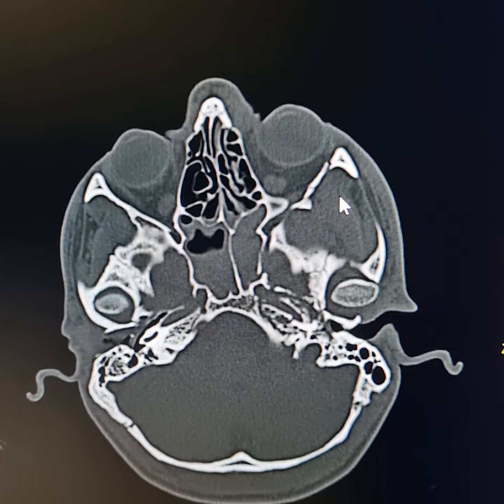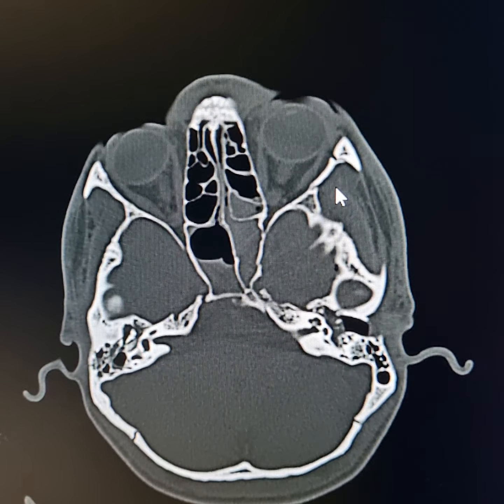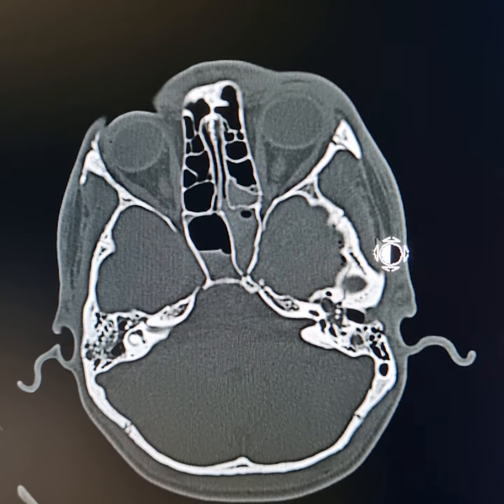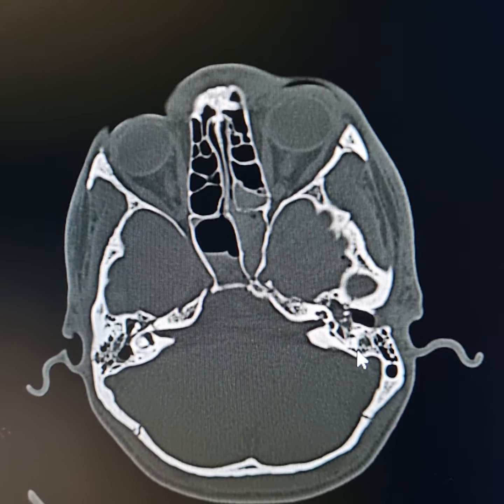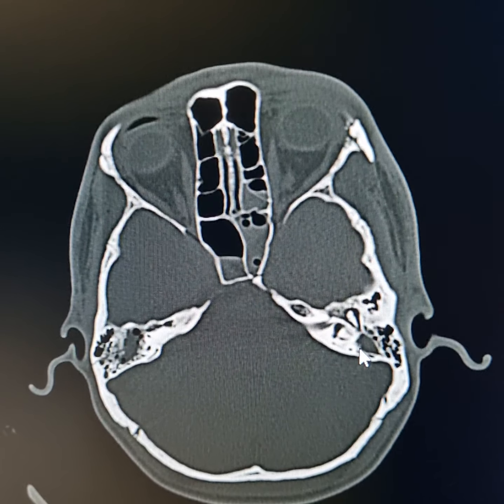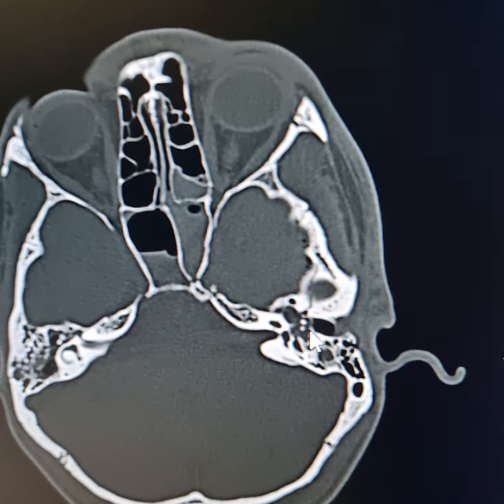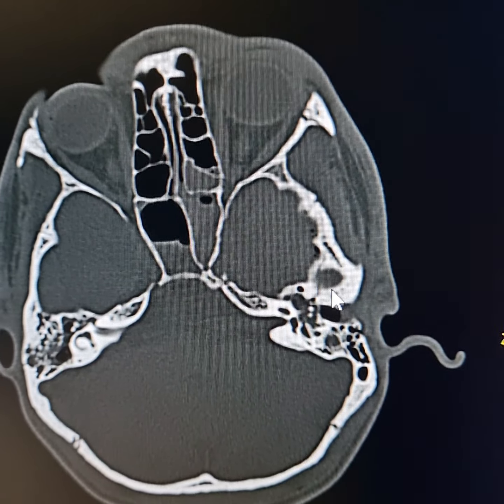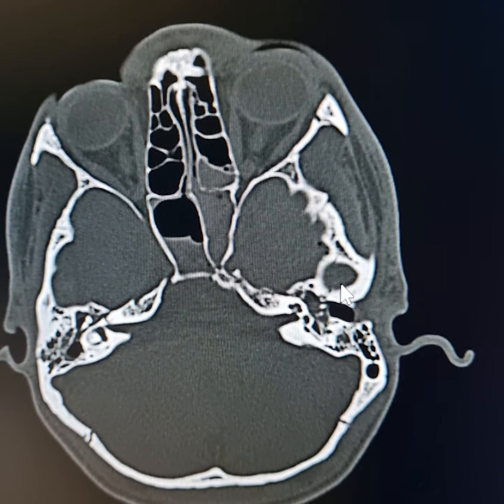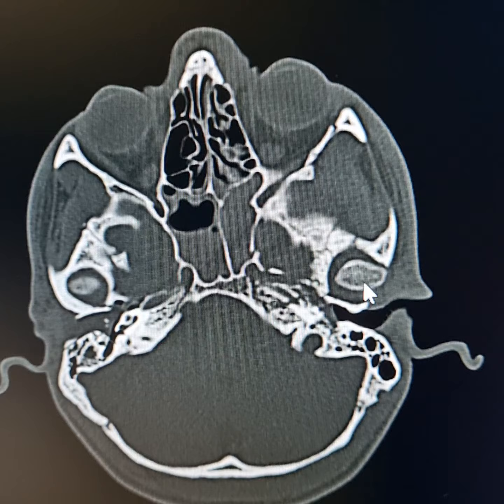As I trace it up, there is a comminuted fracture of the lateral wall of the left orbit. Now please observe this fracture line here, which is passing through the left mastoid, the roof and anterior walls of the left middle ear cavity, and the roof of the condylar fossa for the head of the left mandible.